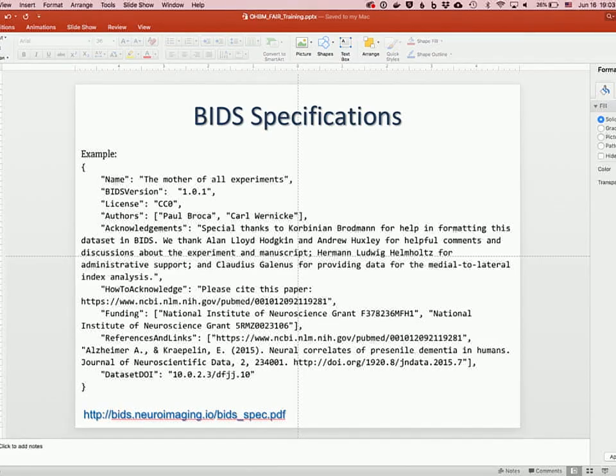Can you confirm, Jeff, that when we're doing this validation, all of that data stays local to your computer? Yes. Even though it says upload, nothing is being uploaded. So this is all safe for your own local data. There's no sharing concerns. The validation happens locally, inside the browser. Nothing is transferred through the network. Everything is local.